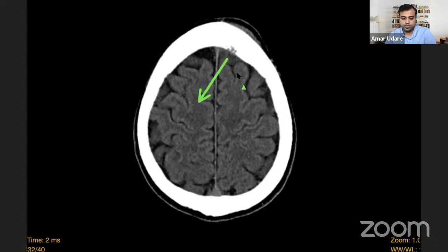in this region. Cortical irregularity, there is this swelling here. As a few of you have rightly pointed out, left subfrontal subgaleal. If this patient had a history of trauma, this would be very typical for that, and we should end it there. But when you see cortical destruction, that would be very unlikely for a subgaleal hematoma. You should be thinking more of lytic soft tissue lesions.